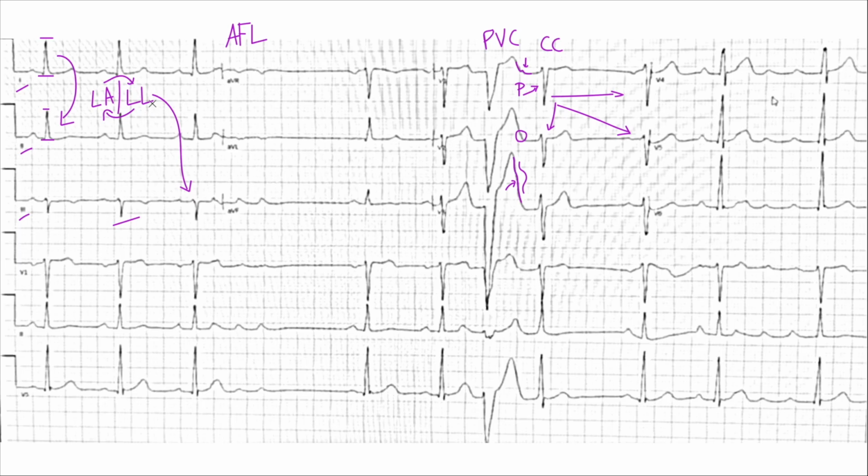What else? And because of this, now we bring into question the rest of the ECG. Not so much the precordial stuff. However, your augmented leads are going to be off. And here, AVR seems to be okay. AVL, I don't know. It was probably affected. To what degree, I guess we'll see. And AVF, they appear to be normal. We'll see in a little bit. I'll show you what another ECG on the same patient looks like in just a moment here. I just want to see what else I can pick off here.